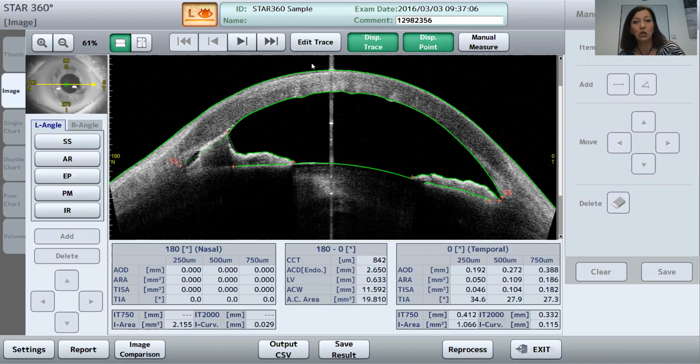So if you take a look at this picture and all the values we see here, we can again click on it, and then we have this referring parameter highlighted in the picture. And this is really nice, and it's a very helpful tool for you for detecting glaucoma and also for the complete treatment. It helps you a lot.